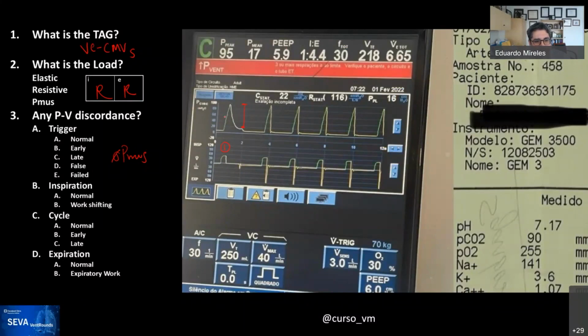So yes, it's absolutely volume control. You read this as it was, and actually I put it down here just for you to be able to see it. This ventilator is in Portuguese, and so you'll have some terms that you're not used to, but this is the same PB980 that we use over here. All the breaths are CMV mandatory.